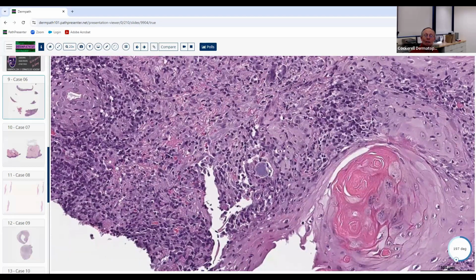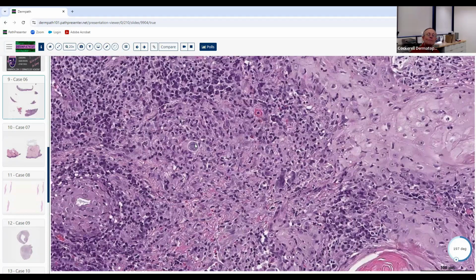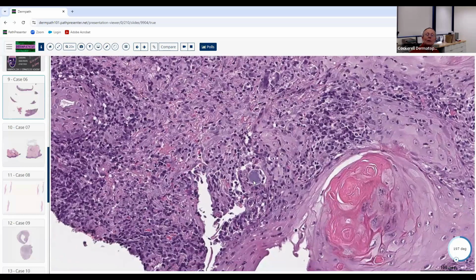If you're going to get on the board examination, this is what you're going to get. You're not going to have to search forever. They're going to expect you to recognize this pattern, to look at this and see this, and then they might give you a multiple choice question. What do you look for in the multiple choice? You've looked at this and said, okay, this is infectious, with spherules. So what answer are you looking for down there?